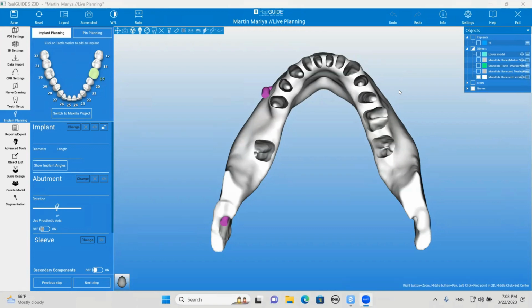One of the problems this poses for us is when that ridge resorbs from the buccal to the lingual, that usually means our implants are more lingually oriented, which can cause an issue with the prosthesis, mainly impinging on the tongue space. And also, if there's a sublingual undercut, this could be very difficult without significant grafting to do a case like this.